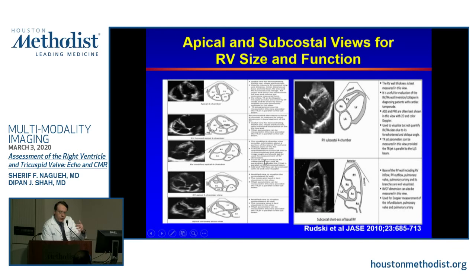You can also do the level at the papillary muscles, and that will get you a more distal cut of the RV. In these views, the RV has a crescent shape. In the older literature, when people were interested in using 2D models to get LV volumes, these areas could be tracked in end diastole, and with mathematical manipulation of the expressions, you can do RV volumes. Nowadays, this is not emphasized.